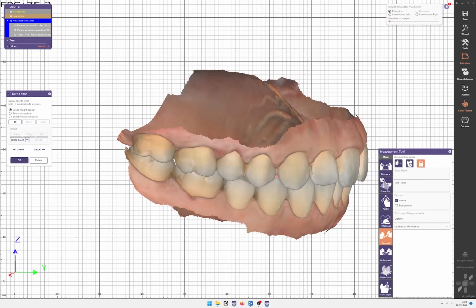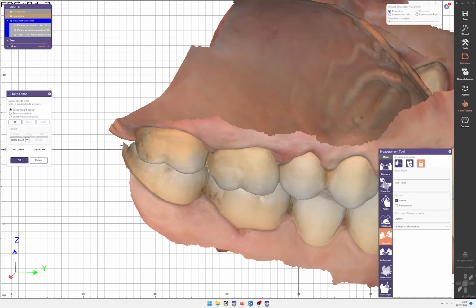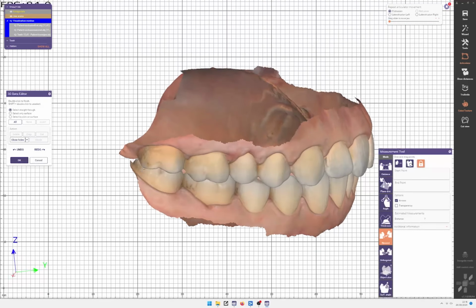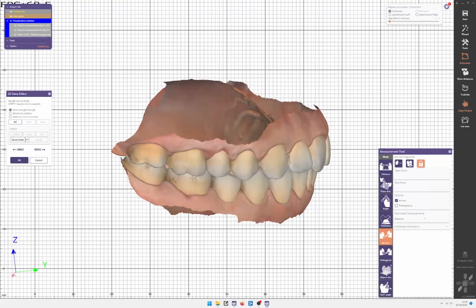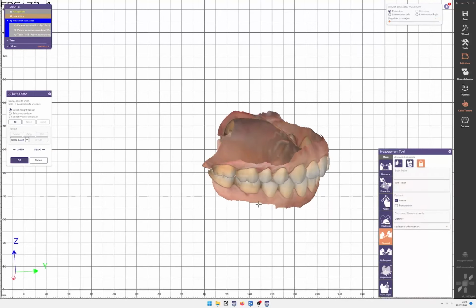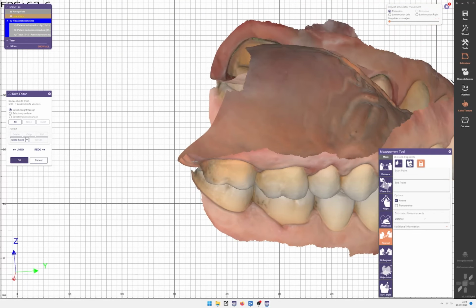The second thing that happens, it can influence your movements, it can influence your protrusion, because the scanner doesn't know what's hard and what's soft tissue. So when it does its movements, if it gets into a contact here before it goes to an edge-to-edge position with the incisors, it can reproduce incorrect movements. So you gotta watch out for that.